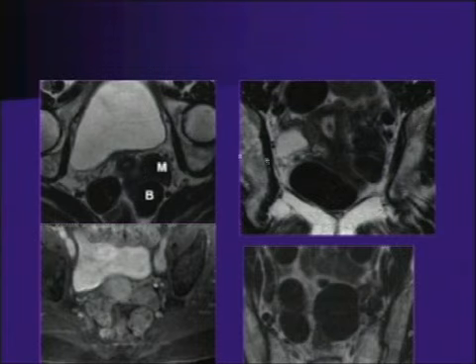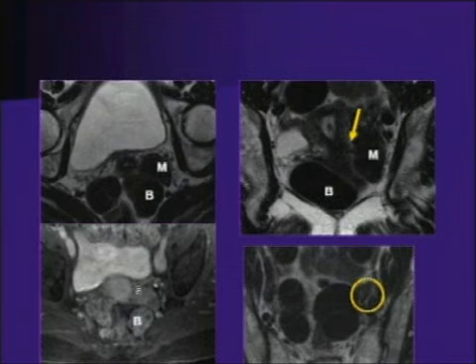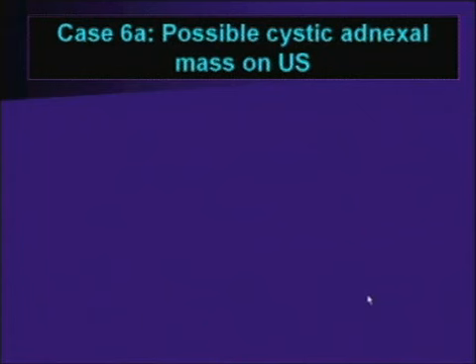We can see on the coronal image the mass here, and we see actually a small stalk, a thin stalk, and a mushroom appearance of this mass. And on contrast-enhanced imaging, you can see it's a vascular fibroid, and we can clearly see higher up a normal ovary on the left side. So here we are very confident that this represents a pedunculated fibroid and can be managed accordingly.